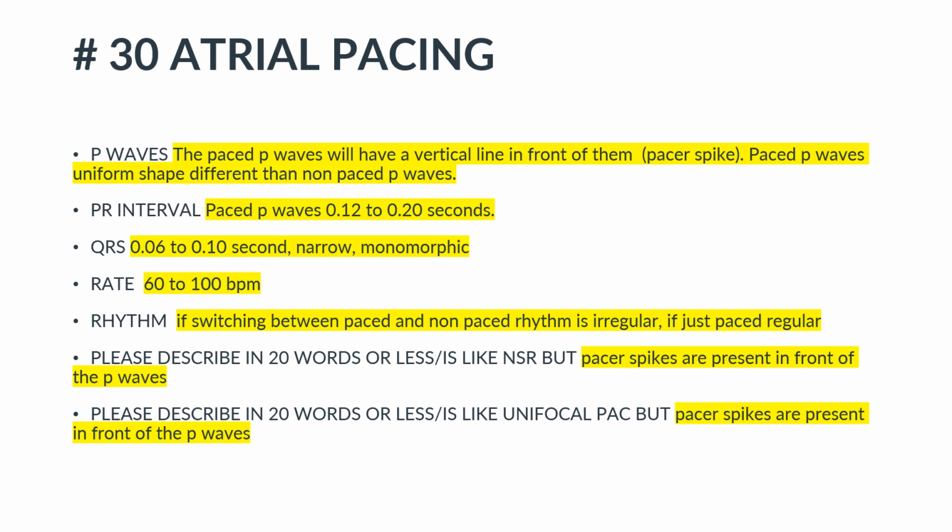All right, so it's going to look just like normal sinus rhythm, except you got that thin line before my P wave. And my P wave may look a little different than what I'm used to. All right, so this is going to be just like unifocal PACs, right? So what's happening is my heart's beating, ba-bump, ba-bump, ba-bump, deet, okay, time's up, you had your chance, zap, right? And that's what's generating my PAC, is that pacer spike. And so that's what's going on here.